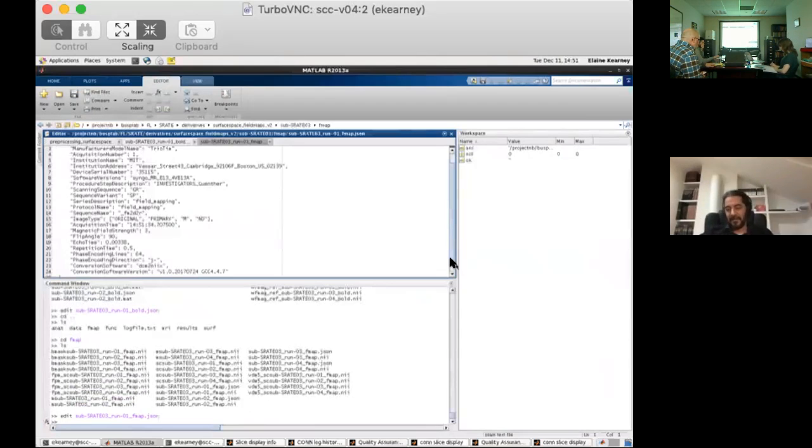Ultimately, we need to do this for data that is pretty old. Yes. What's nice is that we could tell. It would be even nicer if we had a single number that we could look at, whether it improves or gets worse, and it would be consistent. But at least being able to do that visually gives us some confidence that we are on the right track, basically.